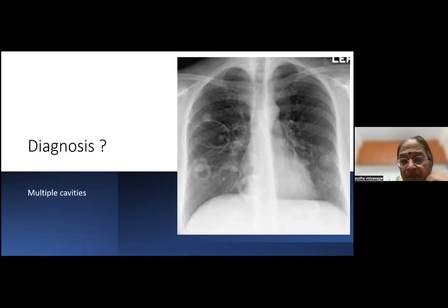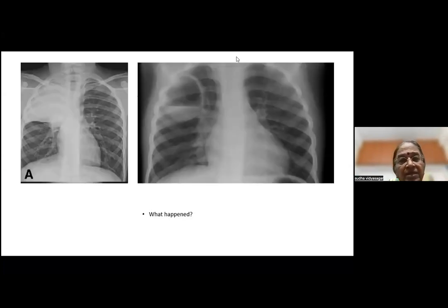Right. Okay, fine. Let's look at that. That's a typical transformation of, what is this? The right upper lobe consolidation, beautifully lined by the minor fissure, trachea in the middle, homogeneous opacity, which can transform into a cavity. So when you're asked for the complications of a pneumonia, that's what you say, isn't it?